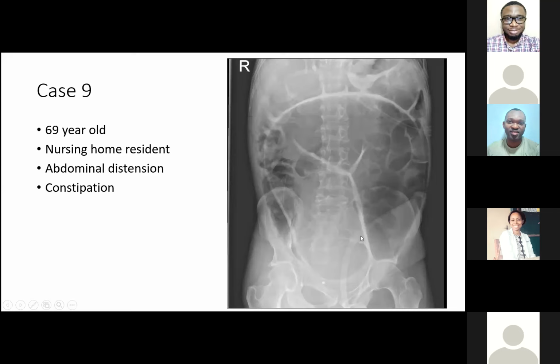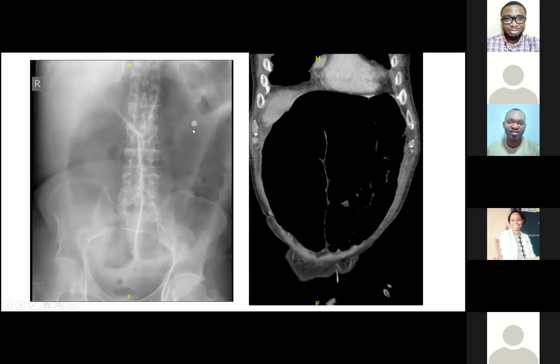While CT scan is definitive in terms of showing you the twist in the mesentery, it's difficult to justify doing CT every single time these patients come back into hospital. So certainly that is one scenario whereby you could make a good argument for doing plain films.